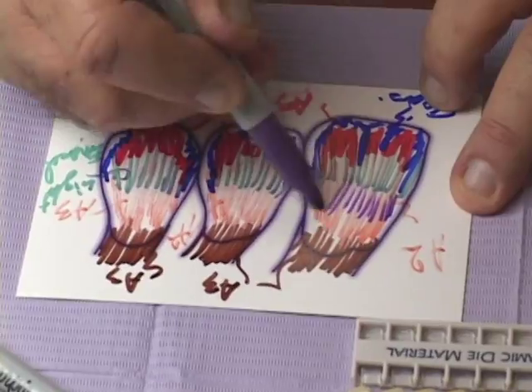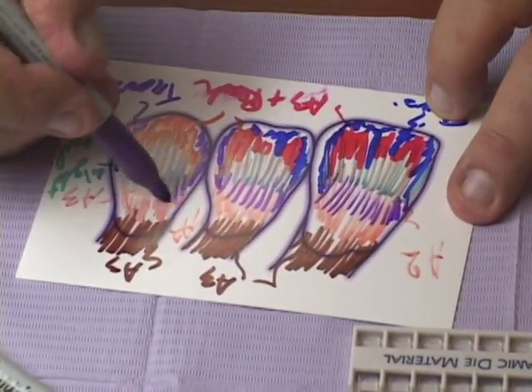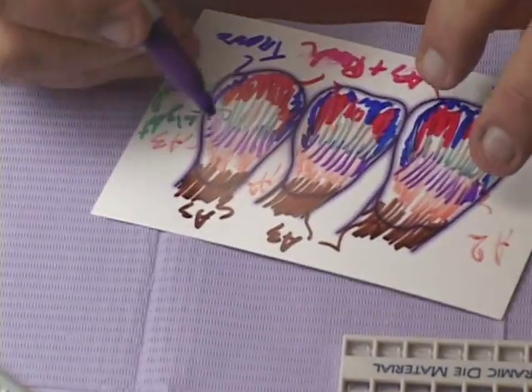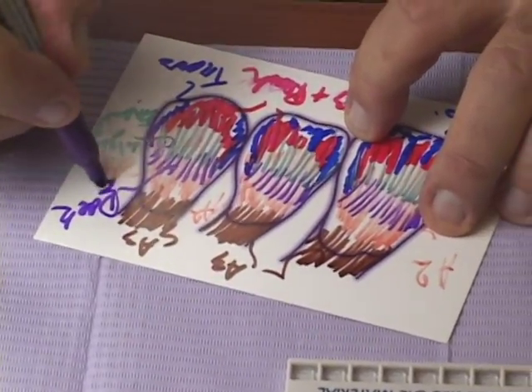Now it could be that we have a little bit more of a gray zone of enamel, and we use the purple pen to describe that part. And the gray zone of enamel is a little bit in the middle third of the tooth, and that will be a dark enamel, where the green was a light enamel.